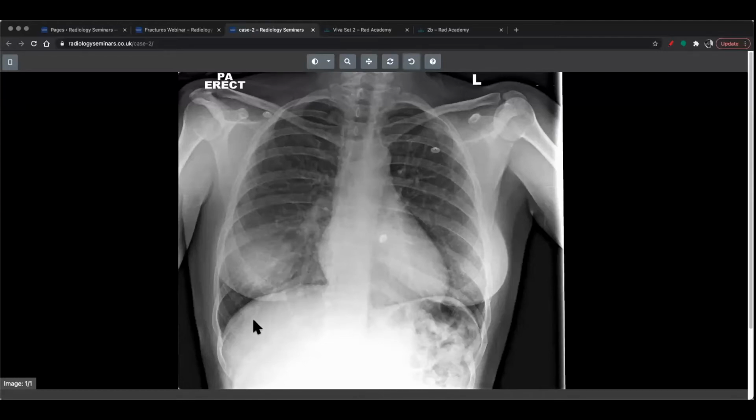Under the hemidiaphragms also looks okay. So we're a bit of a conundrum, right? I've told you that those are the check areas, but there's actually one more check area that I didn't want to give straight away because I didn't want to give the answer to this next particular case. And it looks like some people are very switched on today.